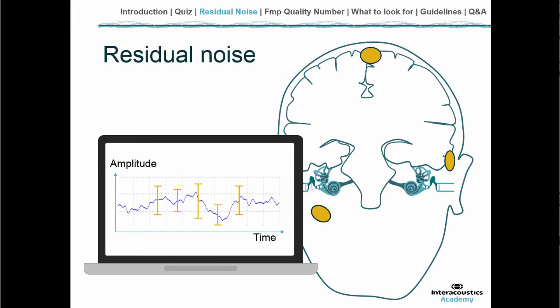So if we now add a third measurement and a fourth measurement, what we will see over time is that the mathematical variance is going to reduce. The longer you measure, the smaller the variance. And if you think about noise, noise is really truly random. It means that it doesn't matter which point on the curve you use for this analysis. You could take 1 point. If you use 1 point for this analysis, the noise value might fluctuate a little bit up and down, but over time it will generally move down.